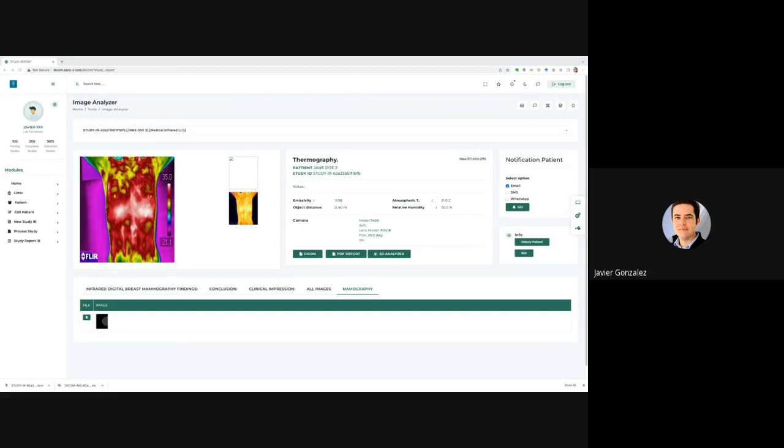I like it. Very simple, easy to use. Yeah, we'll definitely play around with it. And if we see anything that we think may need to be changed or updated, we'll make note of it and send it to you. Yes, please. This is basically testing the functionality of the algorithm and the conversion. You can change the name of all these things like patient, whatever. If you think there's more information that should go in, or if you don't like the colors, we can change it. We were just trying to make something functional.